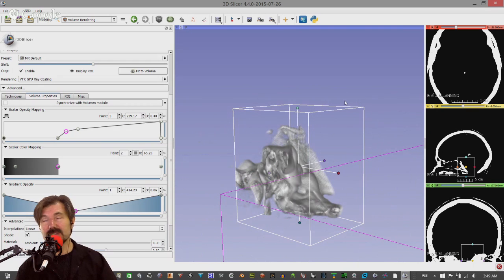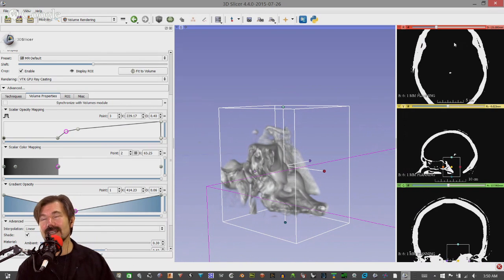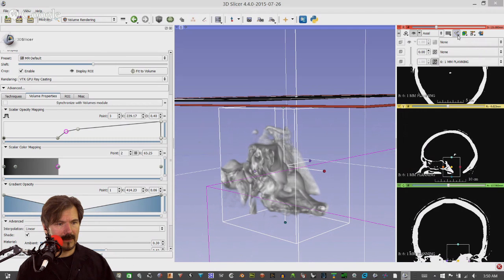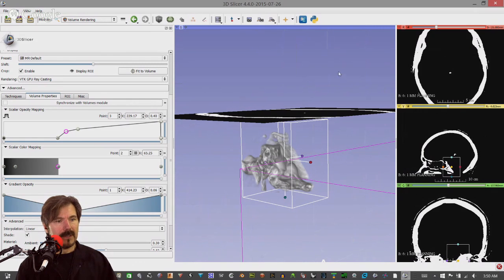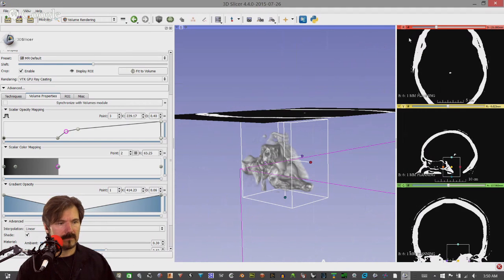Okay, so we have this, but this is still not a tangible model. So we want to get there. And as I mentioned, there is a way, even though I don't remember right now, you can convert the ROIs that you have here to the volume so that all you're segmented to is the volume itself. And I had done it right before the show, but since I have a failing memory, I don't remember how to get it back. And let's see. No, that's not what I want. Oh, well, I won't waste any. No, I've got something there I don't want. No.